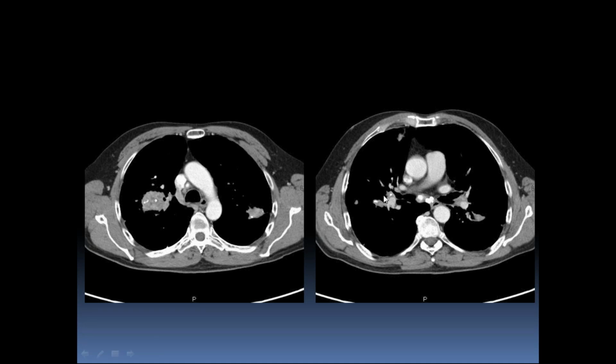And if you take a look at the lymph nodes down here in the hilum and in the subcarinal station, you get these calcifications. So I would be much more leaning towards a silicosis diagnosis rather than a bronchogenic carcinoma. And if you feel that you need to just throw that into the differential, you can certainly just get a follow-up. So that's what silicosis is.